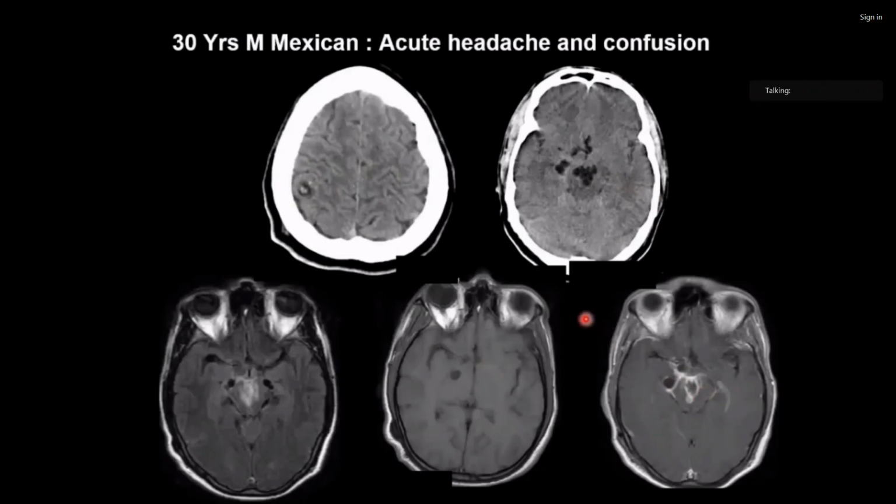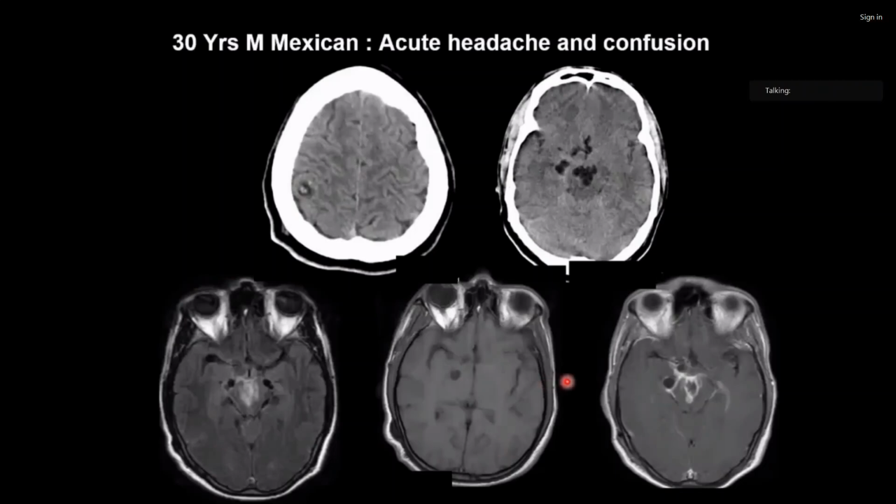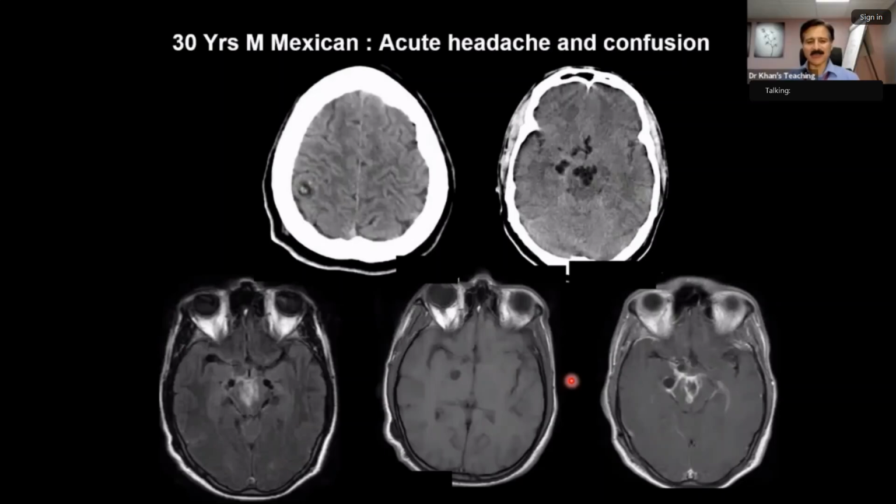What is your conclusion? So I'm thinking this is neurocysticercosis. And why do you say that? Convince me. And you are right, by the way. Because the history is Mexican, so I'm going down that road. So the examiner is very, what we call kind, isn't it?